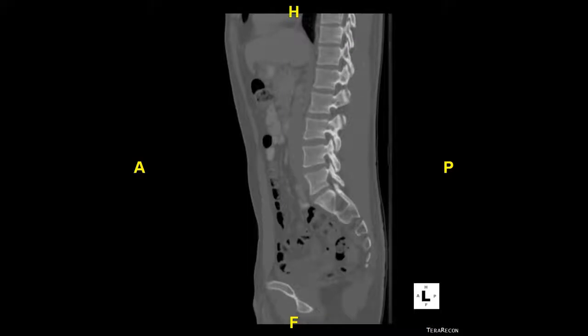We are moving laterally now, so the vertebral canal is disappearing. From here, keep in mind that since we have crossed the midline, much of these structures will be similar to those we looked at in the beginning of the presentation. For that reason, I won't be including the cartoon image to orient ourselves, but will quickly point out the structures we have already looked at.